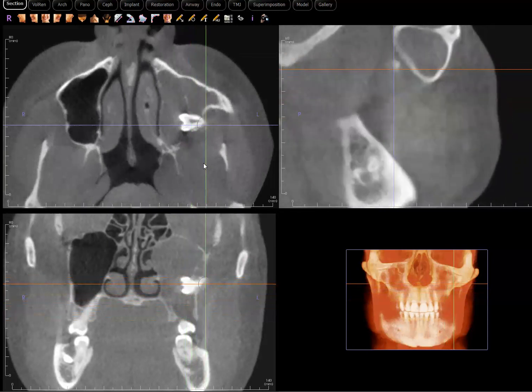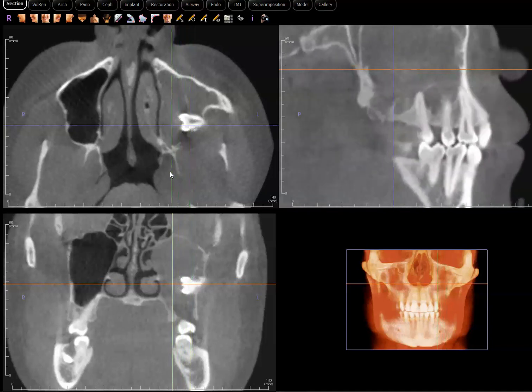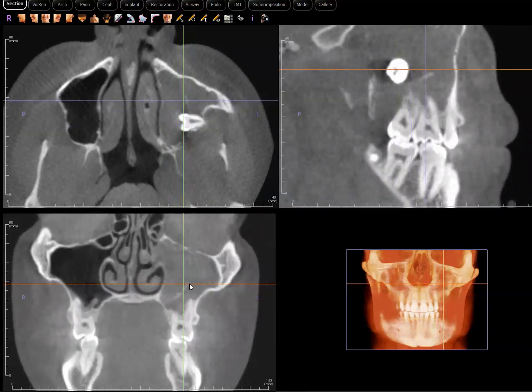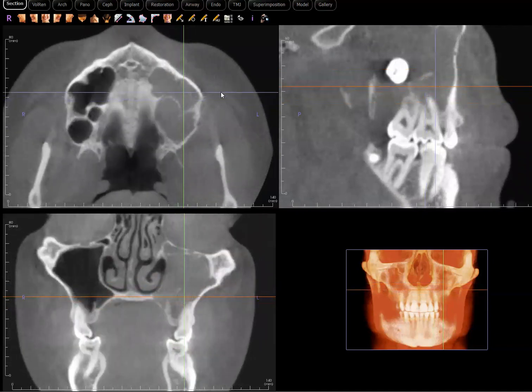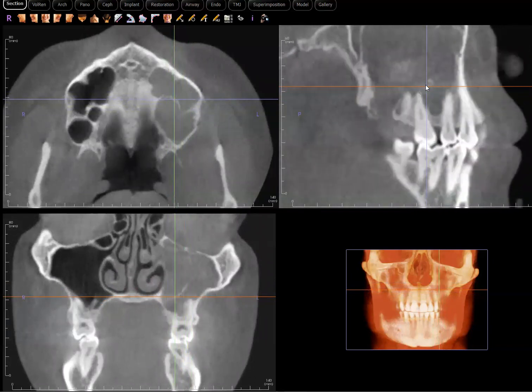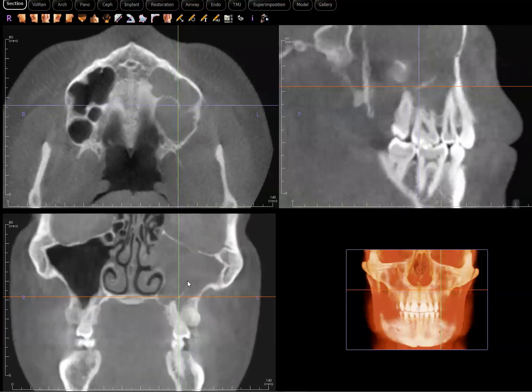And let's see, is there anything else that I want or need to share with you? I think that's about it. I'm sure there are always more features we can talk about. I just noticed now that there's a thin internal calcification or septation. Not exactly sure. I would have to look at this more carefully. But some sort of opacification along the floor of the sinus.